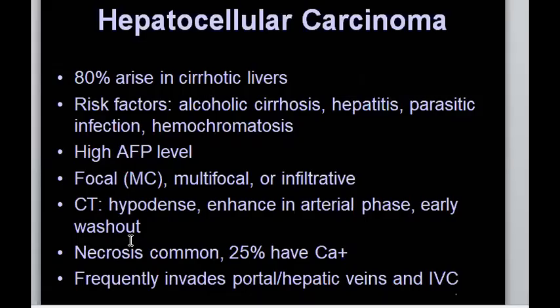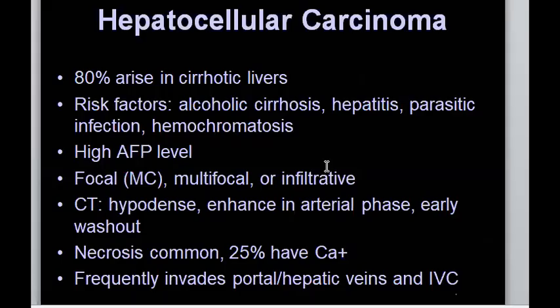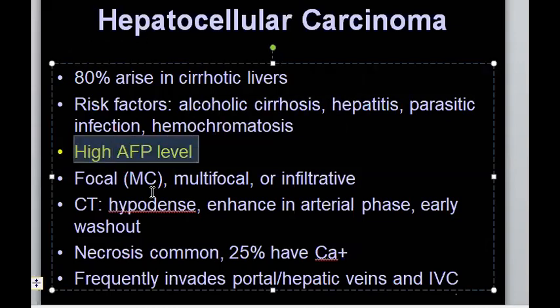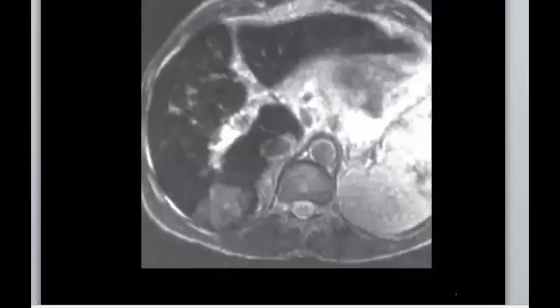Make wash out. Okay. I think this is partial volume probably, so neglect it in this selected image. So HCC, don't forget the triad: cirrhosis, splenomegaly, portal hypertension, and if you will suggest something, suggest to correlate with alpha fetoprotein, okay? And don't forget to look at the portal vein, hepatic veins, and IVC.